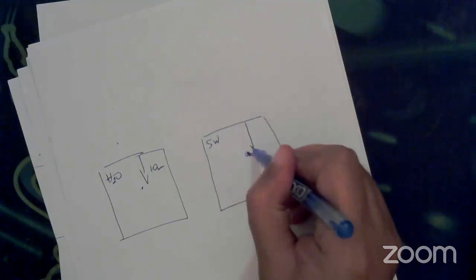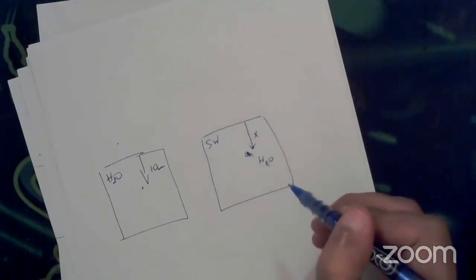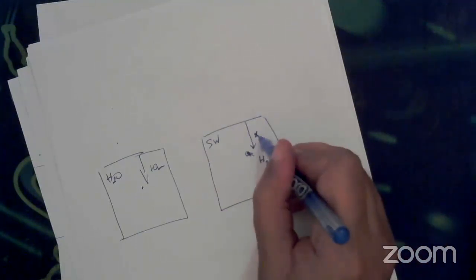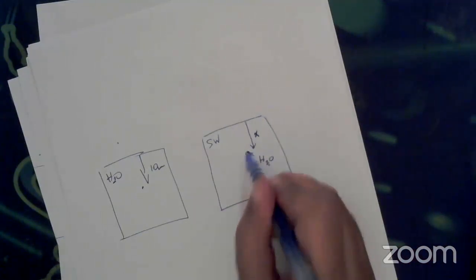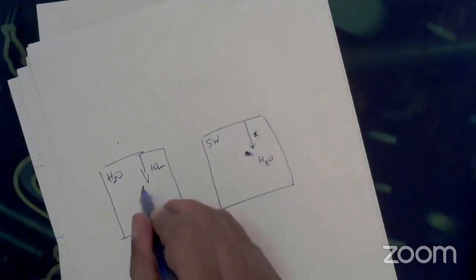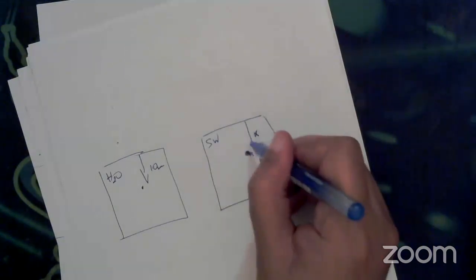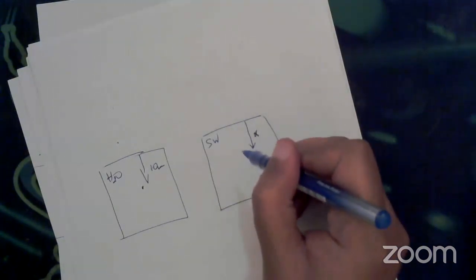So the question is, for the equivalent depth, this depth X, what is this depth X such that the dose in that volume of water here and at 10 centimeter water are the same? When you use the density, your assumption is that because of the density, the attenuation is going to be more.